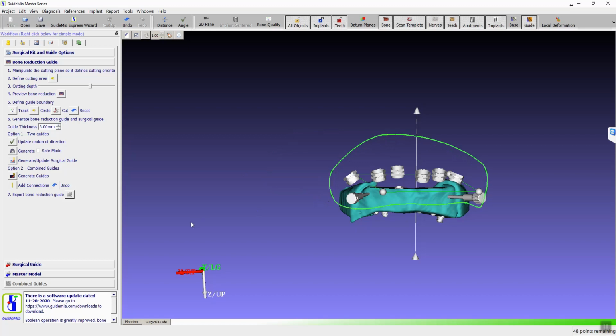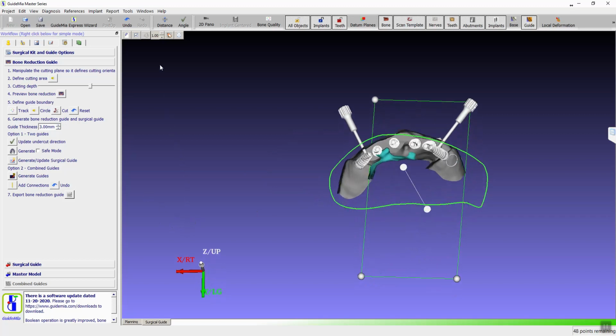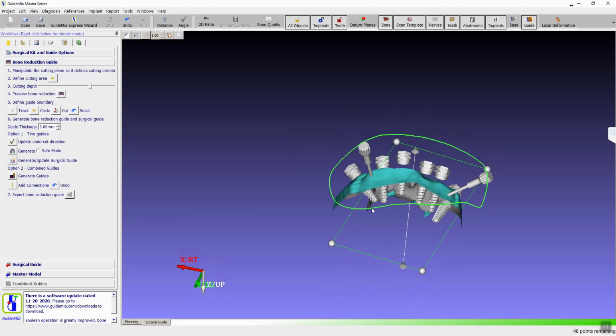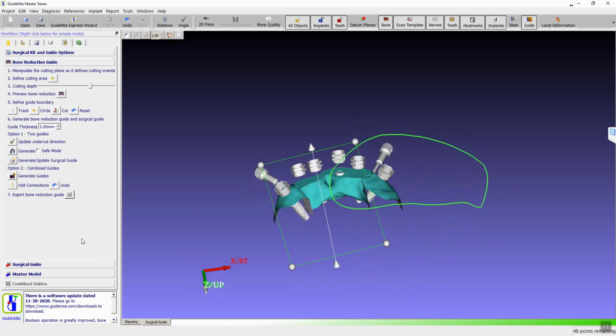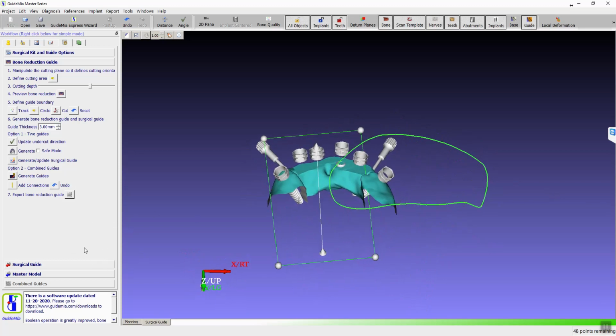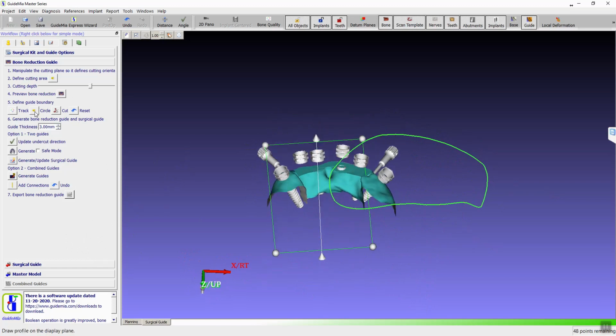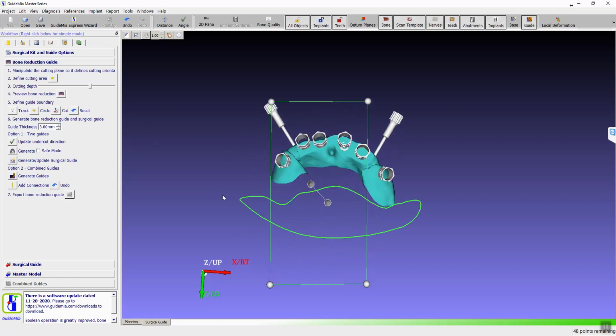Now, I notice you tend to circle what you want to keep instead of circle what you want to get rid of. Depends, right? Like here, if we turn around, then we can do either way. So maybe a better way to do is to do this, for here. Counterclockwise. Yeah, or maybe we get rid of the sharp corner too. We don't need that. And then you click cut, and that removes whatever you circled.